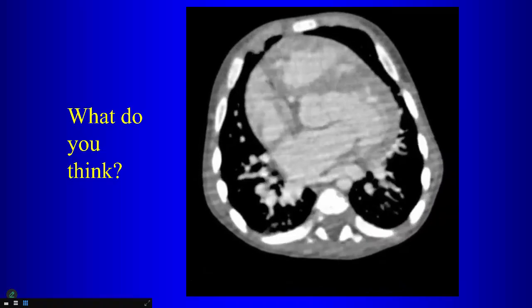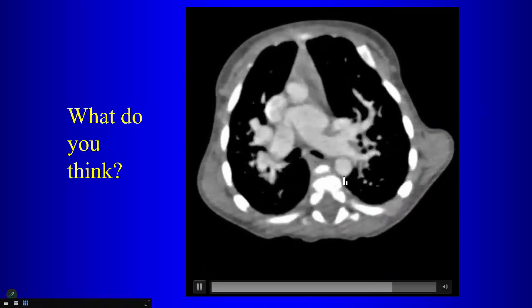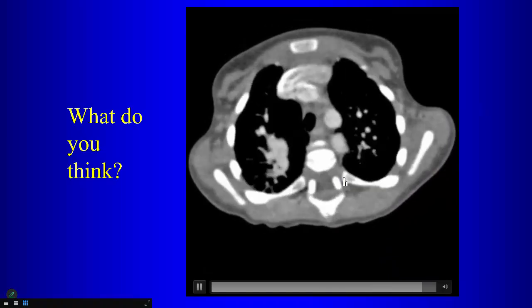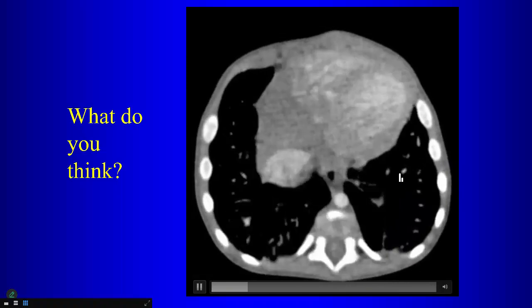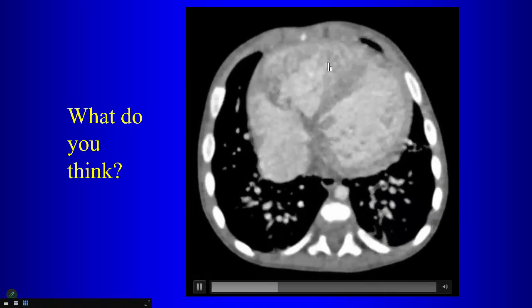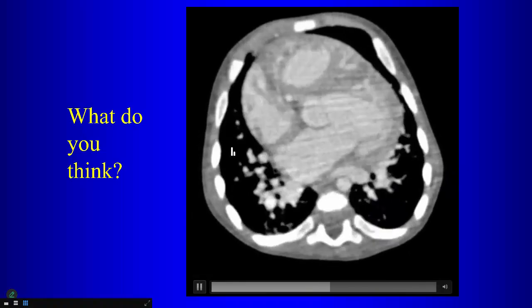Concordance. And the left atrium connects to the left ventricle, so there's atrioventricular concordance there too, okay? Now the next thing to do is to identify what the ventricles connect to. What is the outflow of the ventricles? So you follow the right ventricle here, follow it up, and tell me what it connects to.